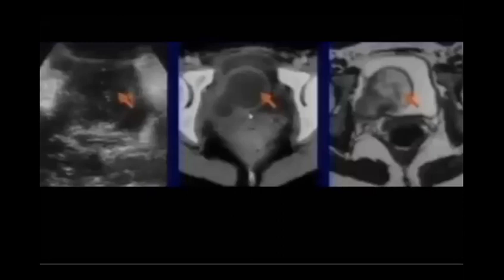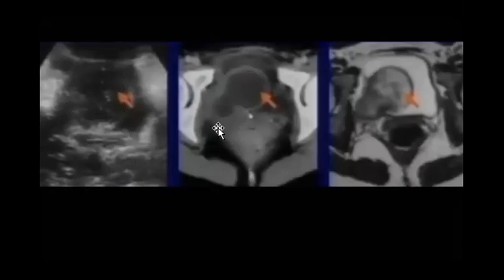And something nice to know is that you can also put something like this in the differential diagnosis when you have this appearance. Maybe you can note that the signal pattern of this lesion, at least in this T2 image, is similar to the muscles here. It is low signal. Perfect. So you can put leiomyoma as a good differential diagnosis.